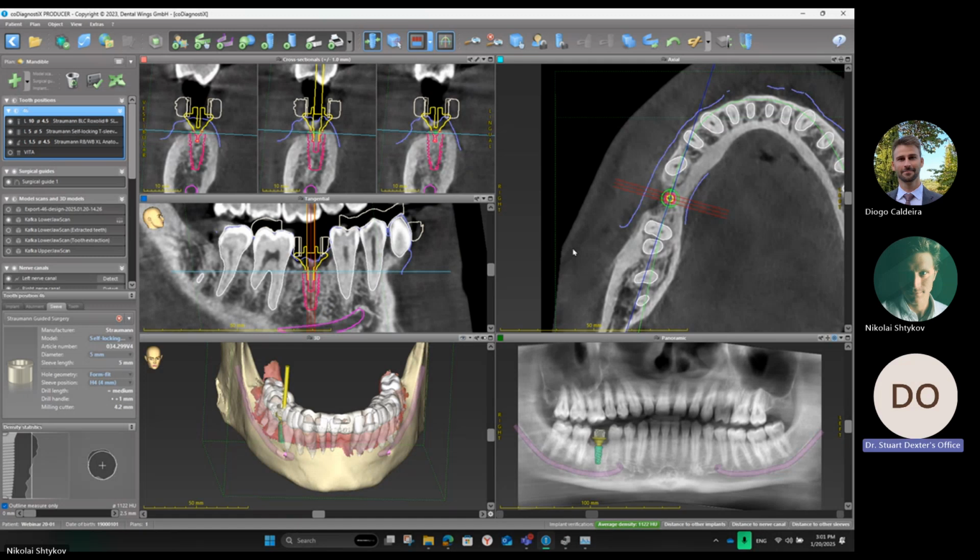Okay. So for the surgical guide systems, most of the data is in there, at least for some of the systems. So that your sleeves will have the drill offset for those systems. You mean the drill offset for the sleeve? My question is this: if you are using a system other than Straumann, will the drill sleeve position be correlated to their guided drill system? Of course, they are. If we have the sleeve in the list, they are. If you don't have it, you need to design your manual sleeve. Okay. Got it. Thank you.